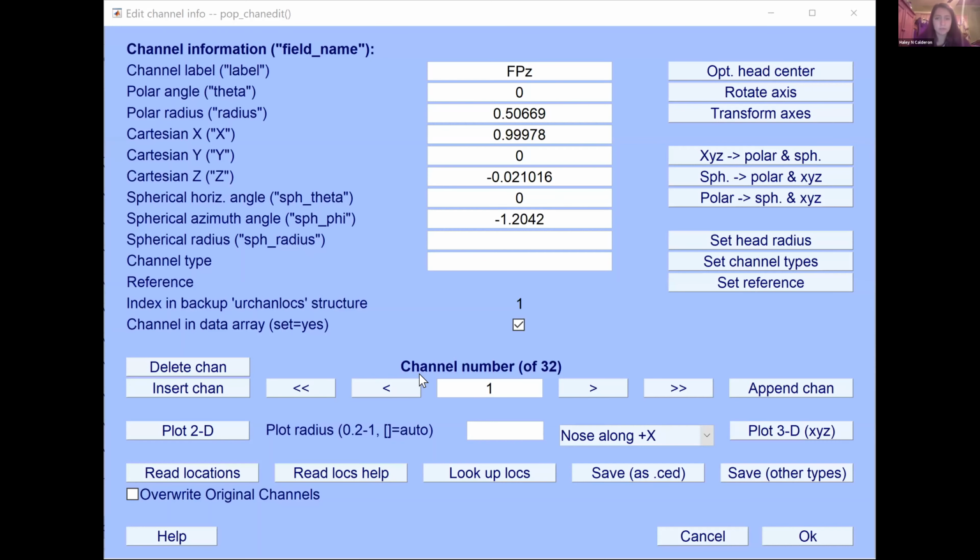Okay, so then we come back. I was wondering that went away. So you come back here, and you've already read in the data now, right? Okay, so you can either view this 2D or 3D. I'm kind of getting ahead of myself. I'll touch base on this in a hot sec, but I just want to show you since I'm here. So plot 2D.